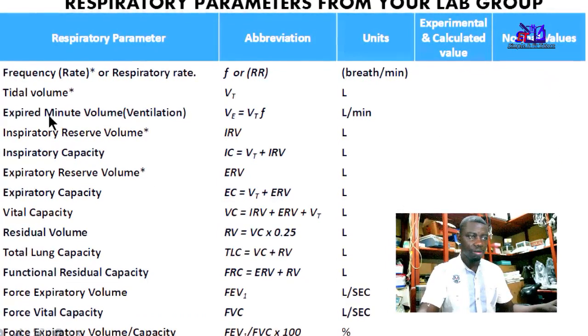You're going to be moving data from the Word document. You collect the information and fill it in here, the one with asterisks. Once you have them, you'll be able to perform the rest of this calculation with them. So be on the lookout to make sure you get this information onto this table, and then you complete your calculation using these parameters.